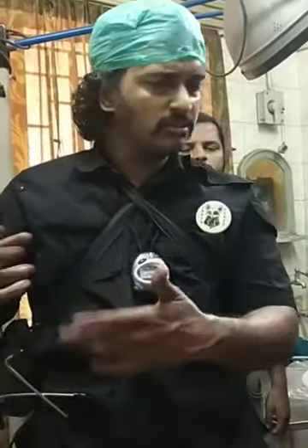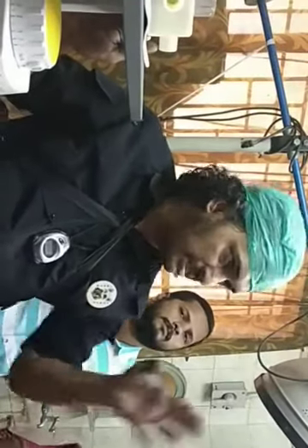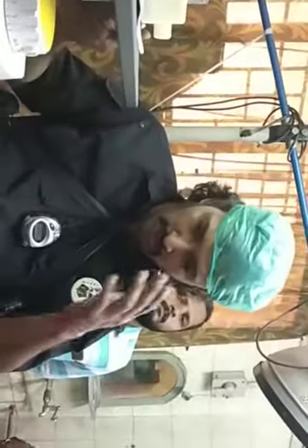And if something is wrong, you just have to call the technician, get it fixed, and always try to spend time with the technician so that you see what they are doing, so that then you also are aware of the machine. So the machines have to be like your toys. You literally have to play with them without damaging them. Okay, that's very important. You have to literally know them like the back of your hand, like a child knows his toy. Because in an emergency, you have only seconds. That's not the time to know what's wrong. That's the time to apply all the knowledge, and that's why you need to be very familiar with your equipment, because without being familiar, you won't be able to keep your patients safe.